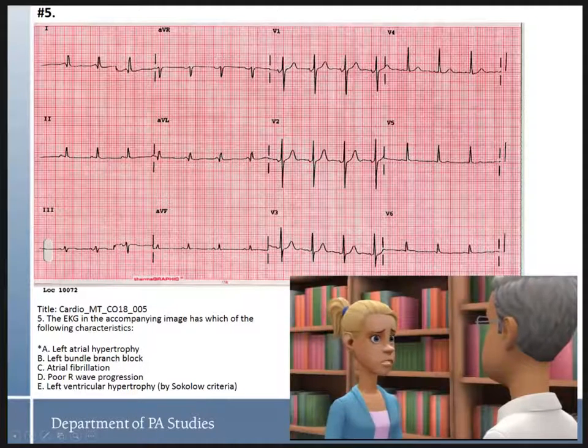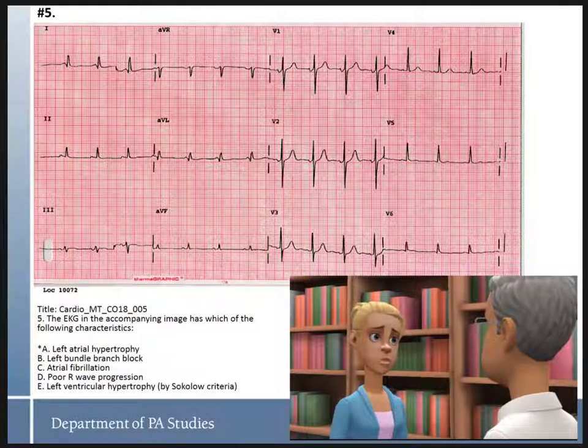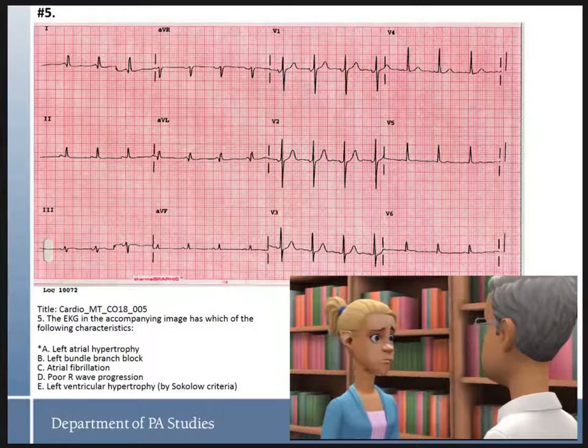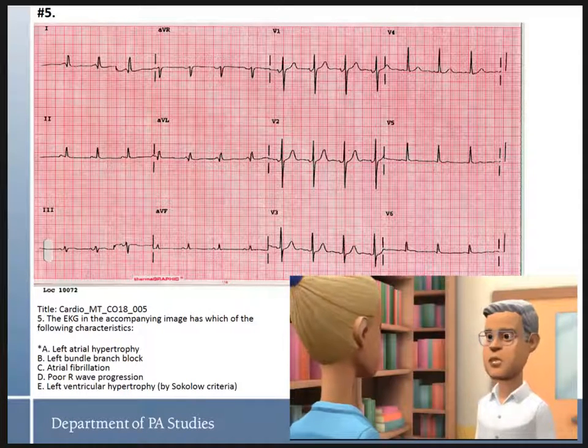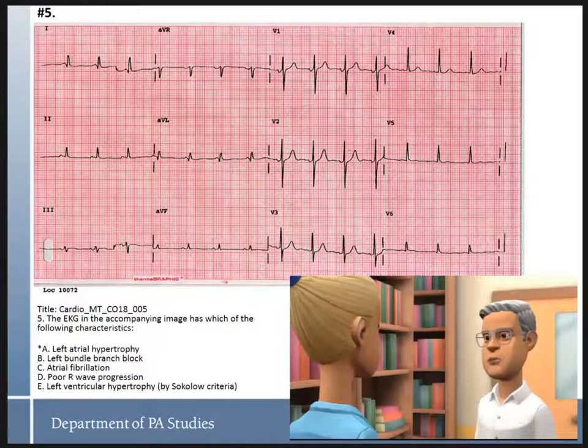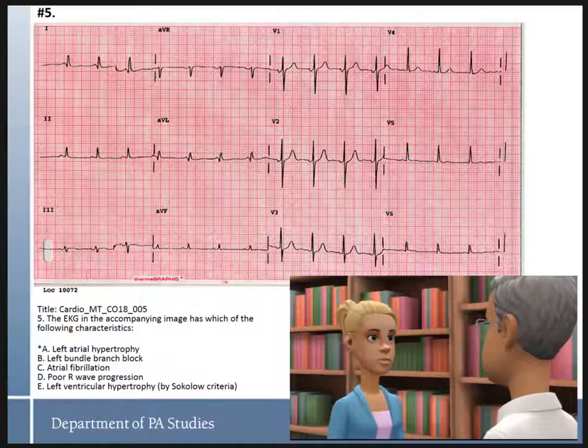Bob, I hate to interrupt you while you are reading these old-fashioned things called books, but can you explain this EKG to me? Of course, I was actually just heading back to the bathroom, where I have been holding a review class. I'm pretty sure I should get credit for this.